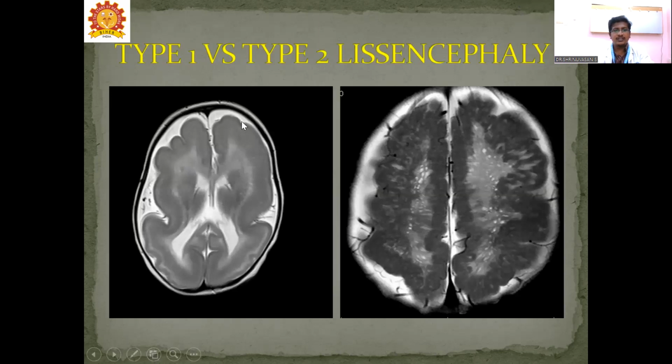So you can see this figure of 8 appearance of the brain, where there is band heterotopia. You can see the cortical gray matter, white matter, and the abnormal ectopic location of the gray matter, and smoothing of the brain. Pachygyria, agyria complex. This is an absolutely smoothened brain, and this is called Lissencephaly.